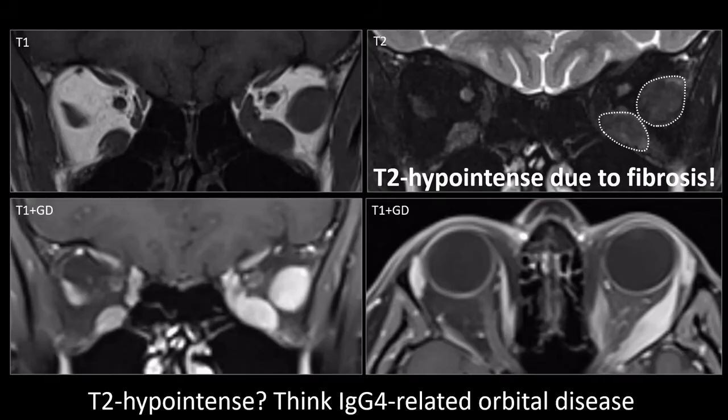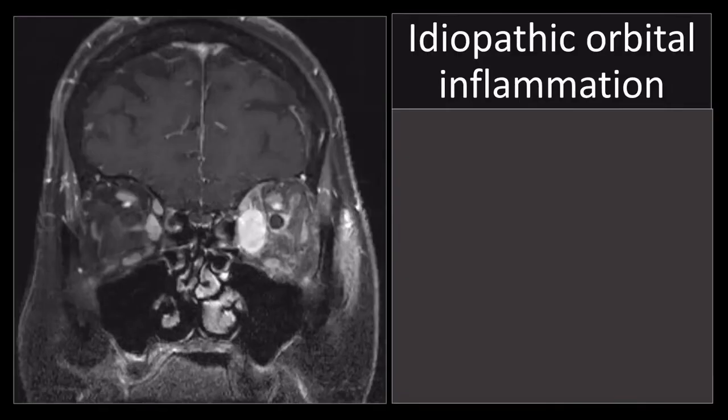IgG4 related disease is a disease process that can be multisystemic. It can involve basically any part of the body, but frequently involves the orbital compartment. And very characteristic for this autoimmune disorder is that it leads to fibrosis in the involved structure, and in the case of the extraocular muscles, these will appear dark or hypointense.